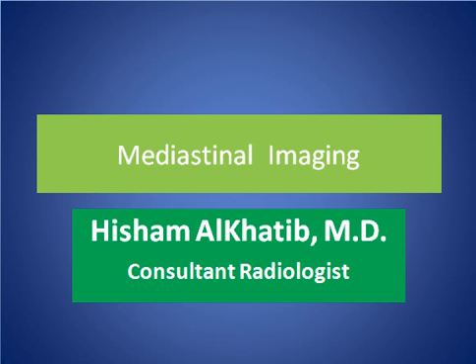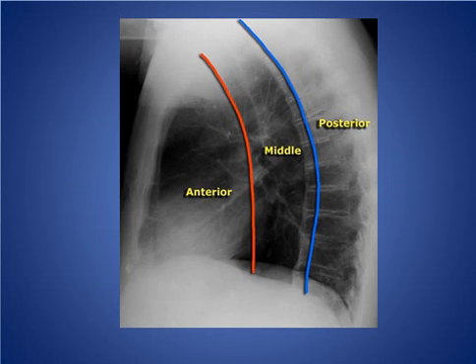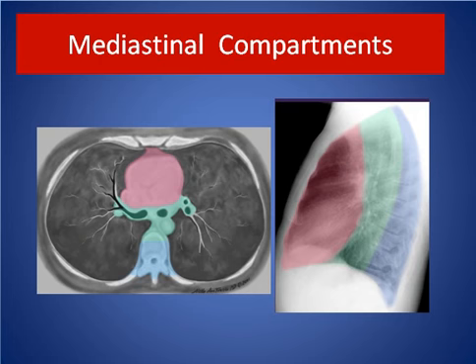My topic today is a continuation of mediastinal imaging, and here I will discuss the posterior mediastinum. As we see here, this is the anterior mediastinum, this is the middle mediastinum, and this is the posterior mediastinum, and it is posterior to the line about 1 centimeter posterior to points connecting the vertebral bodies anteriorly.